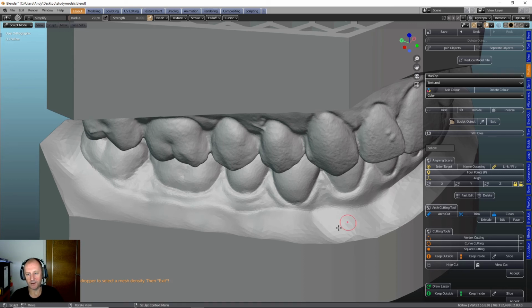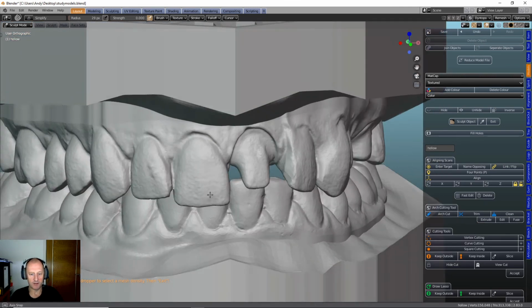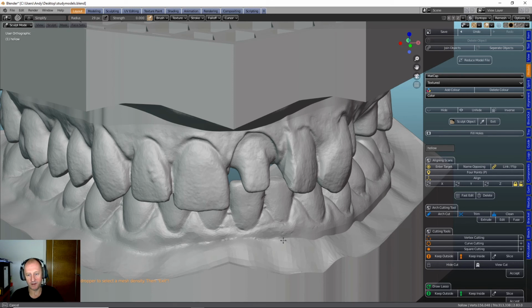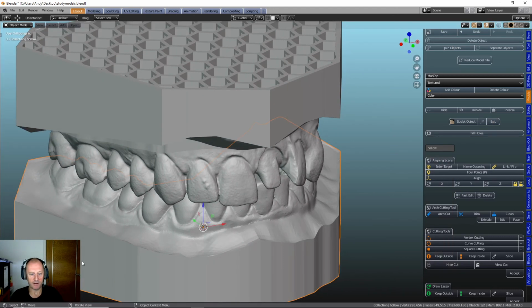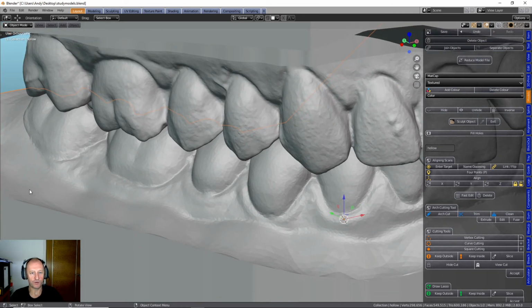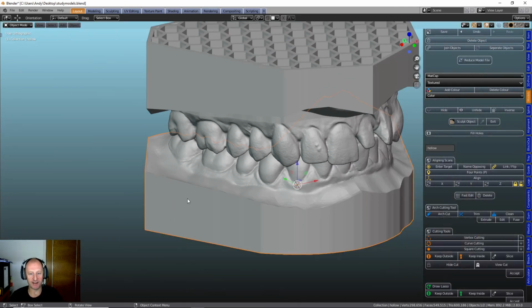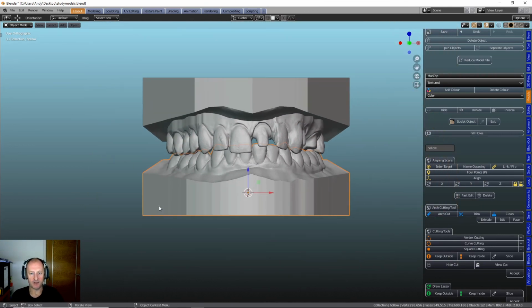And this is the great thing about Blender. You've got all these tools to use, and you can use them at whichever point in the design process you want. They all do the same thing. And there you can see we're just going around, smoothing over, and you get to a point where, if I just exit out of there and have a look at that, it all looks as though it's one homogeneous unit as opposed to something that's been dropped inside something else. It's not essential, but it's another little feature of Blender that we can play around with. So there we have it.